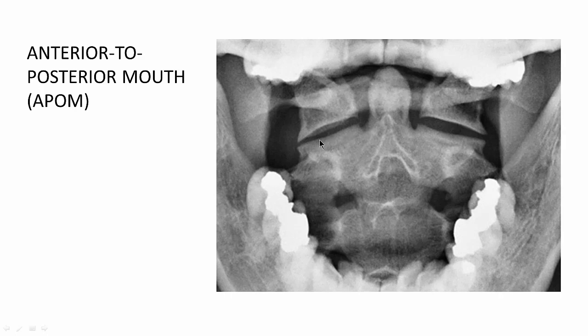Okay, you can see the superior articular process right here. We said this is the lateral atlantoaxial joint here. Here's another one here. And transverse processes would be out here for axis or C2. Right here. Here's an IVF. Remember I said it's kind of a strange angle. That's C2. Here's a pedicle. See the extra thick bone? That tells you that's the pedicle superimposed.